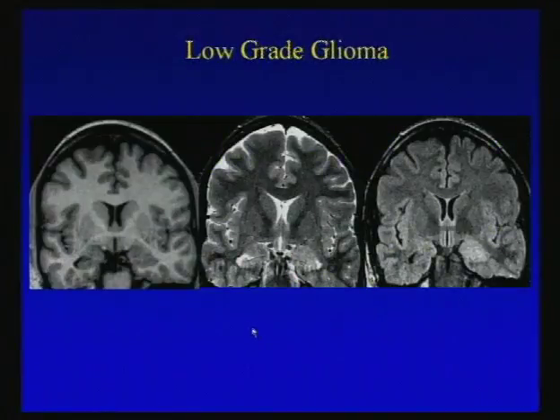So this is a patient with a new onset seizure, and if you compare side to side, the first thing that may strike you is the dilated temporal horn, but if you look at the contralateral side, you see that the hippocampus and the amygdala are enlarged. There's subtle high signal intensity within the medial temporal lobe structures, and we certainly would give contrast in this case.